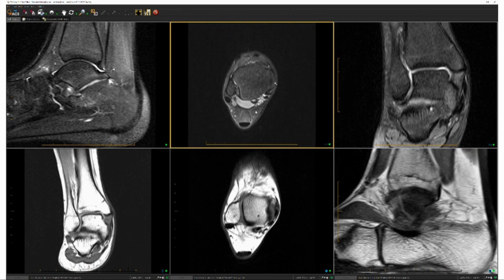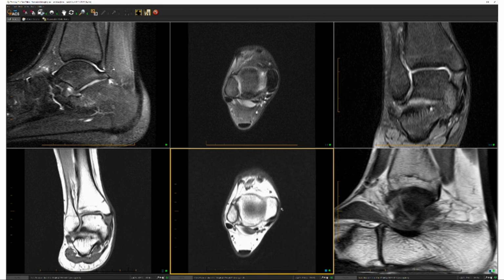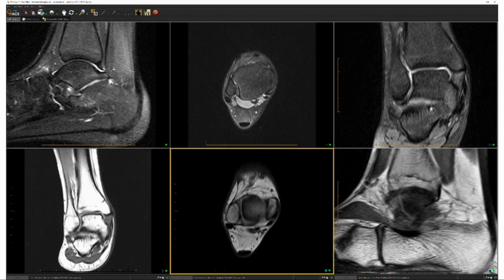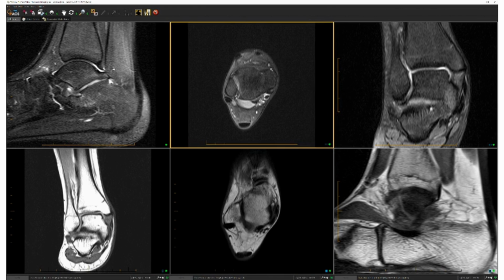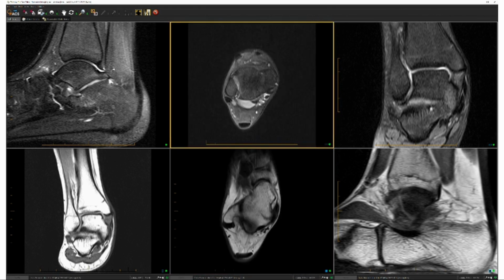And then moving on to the superficial deltoid, I want to go to the medial malleolus, and I want to see the origin of, mostly I'm looking at the tibiospring many times. Of course, we know that the tibionavicular is in this range, but that's not often torn in my experience. The tibiocalcaneal also back here, that looks pretty good. Looking at the tibiospring, minimally thickened to normal.